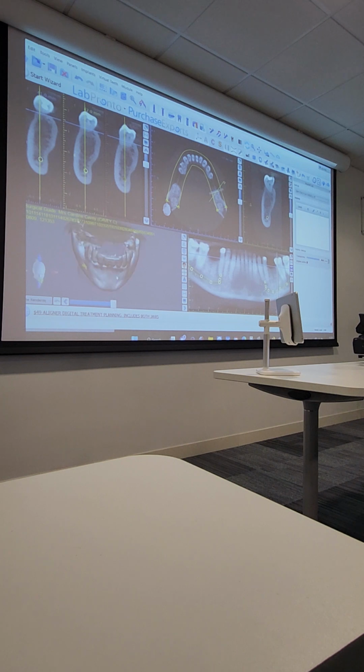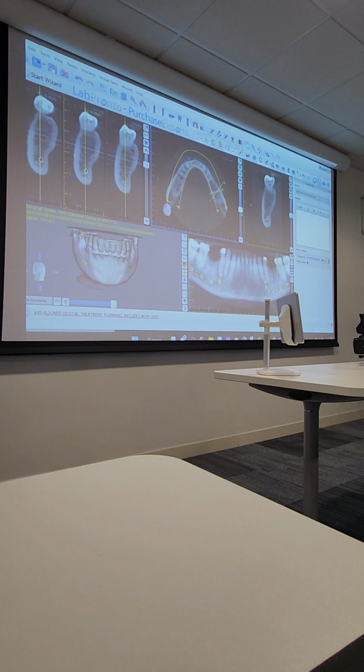Okay? When I do that, I've lost the ID nerve. So what you need to do is probably here. Make sure you look at the blue line on the top window. You see the blue line on the top window? So that goes up and down. If you're down here and do your panoramic curve there, then you're going to lose anatomy.